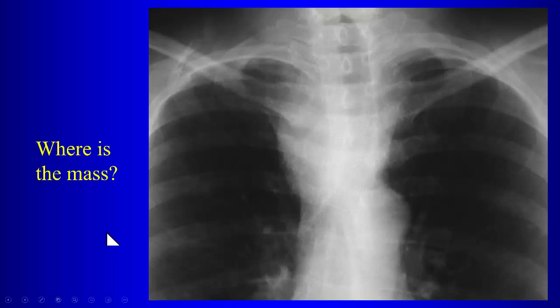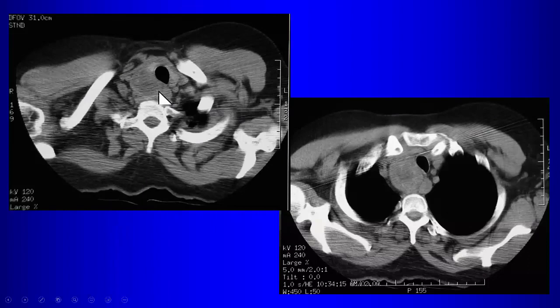Thyroid. Why thyroid? What other finding is there? The trachea is deviated, yes. If you have a thoracic inlet lesion here, right paratracheal opacity, with deviation of the trachea, we always consider thyroid masses first, right? So that is a thyroid goiter, enlargement of the right lobe of the thyroid. That is giving you that.